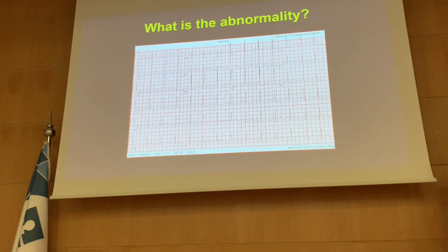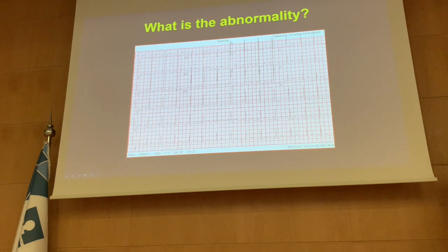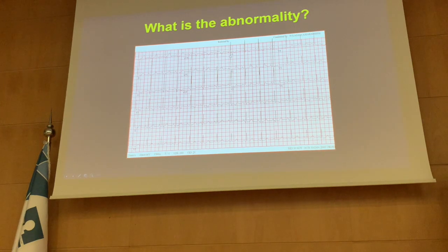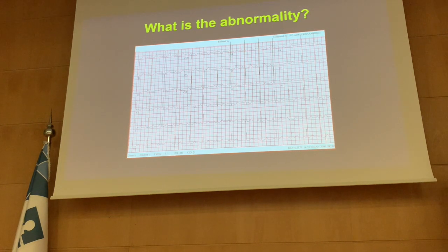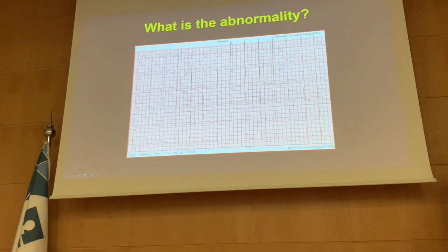If you remember from the first lecture, we said if the patient has a positive or big R in V1, it cannot be anything except 7 differential diagnoses. What are those? Yes, dextrocardia. Okay, good. This patient may have dextrocardia, we don't know.